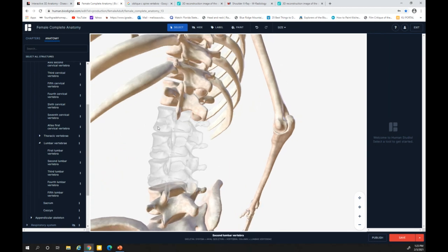See, he's still superimposed over the body of the vertebra. Everything else is hanging off the back. Can't really see it on the vertebral body. Right, so what's of interest is actually on the vertebral body itself. So I don't know if maybe that might help you, as far as identifying the image.